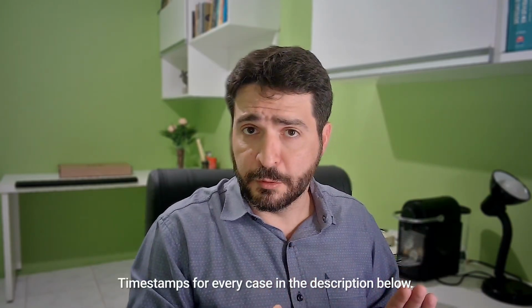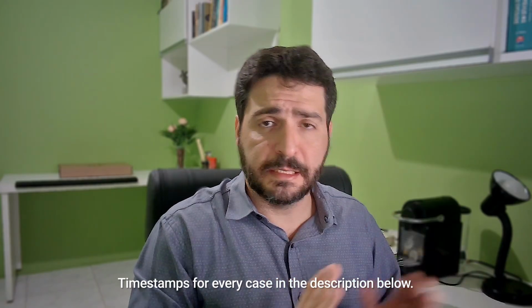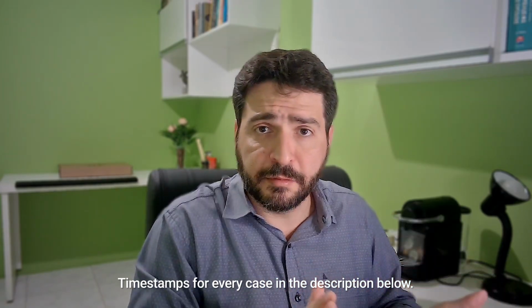Hello everyone, I've got some MRI scans today, so let's go over them from clinical history all the way through the finished report. I'm going to show you guys every sequence and comment on how to analyze the images. And don't worry, I'm going to try to make it as easy as possible whether you have experience or not.